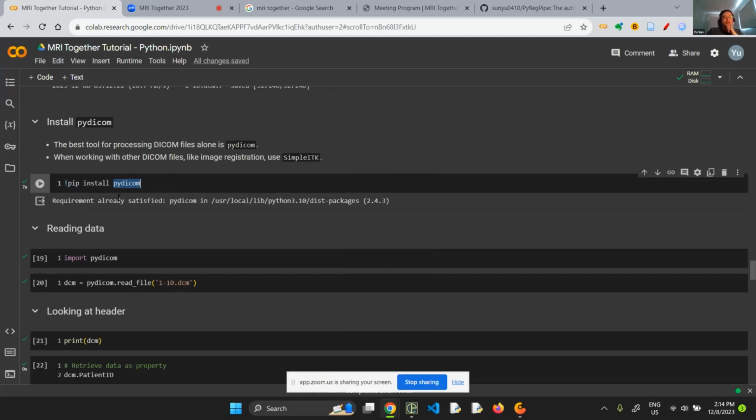There are many other tools out there, and for reproducibility, you should use a more advanced package manager like Poetry that will lock in not only the package itself, but also the version and also the exact URL where that wheel file is downloaded. A wheel file is just that Python package file that it downloads and installs. All right, so here for simple demonstration, we use pip to download it.